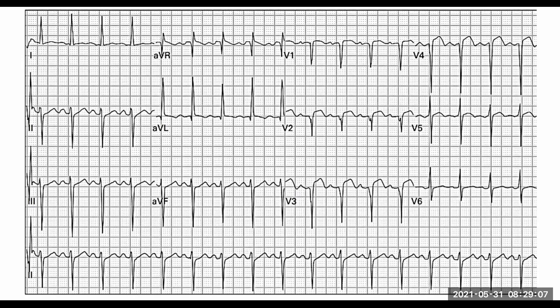Let's look at our PR interval, in other words, the time from our atrium to our ventricle. We've got 1, 2, 3, 3.5 to 4 around there. So it's still within the normal. So we've got a good PR interval. Let's look at our QRS complexes themselves. Are they narrow or are they wide? Quite narrow, isn't it? So that means the ventricle is listening to the atrium.